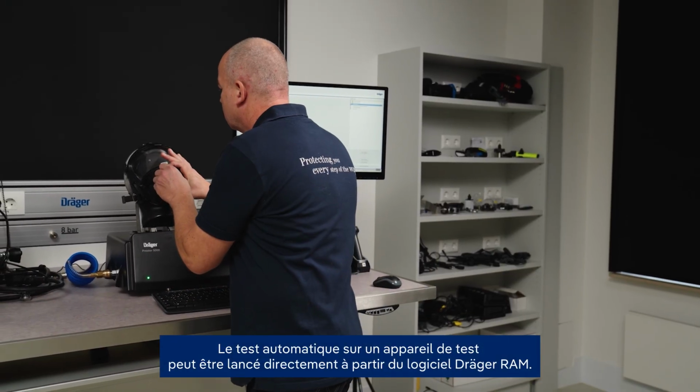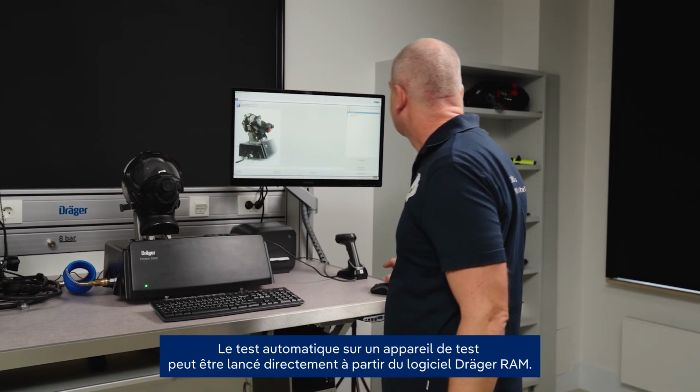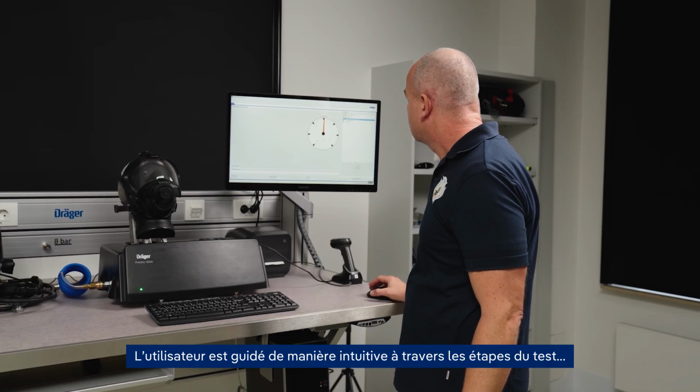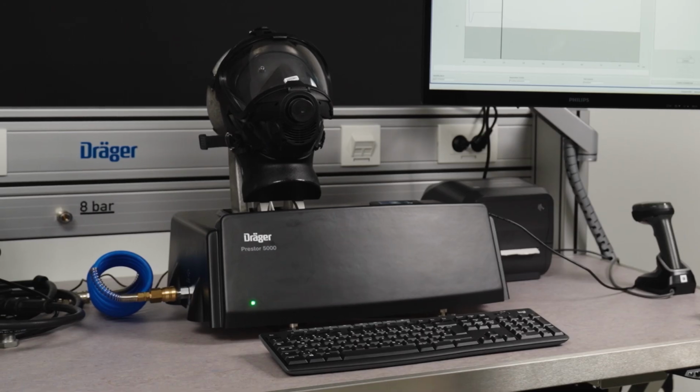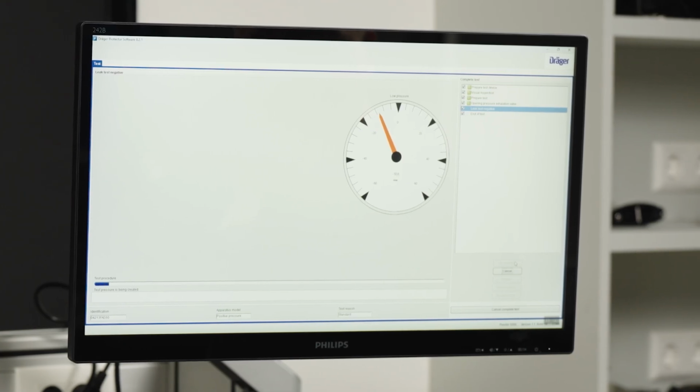The automatic test on a test device can be started directly from the Dräger RAM. The user is intuitively guided through the test steps. Printed if required.